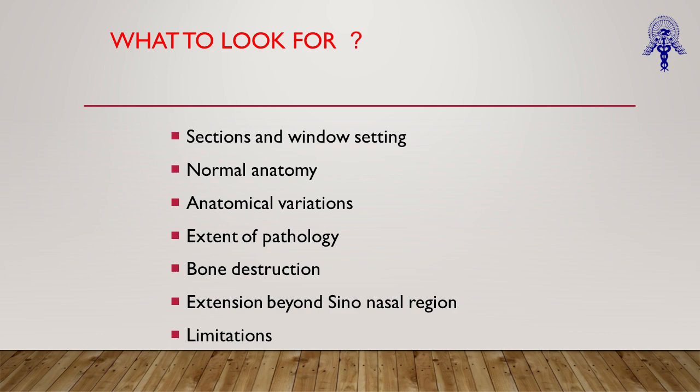And you also need to know the degree of bone destruction, and you also need to understand whether there is bone destruction extending the disease beyond the sinuses or whether there is bony expansion. We know there is a very classical disease called allergic fungal rhinosinusitis, AFRS.